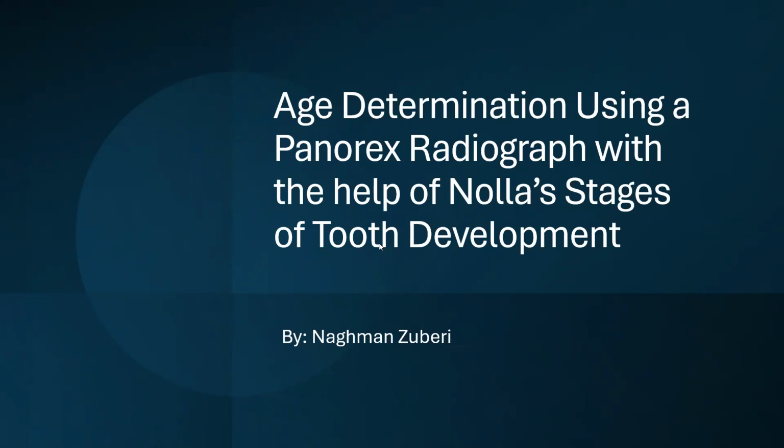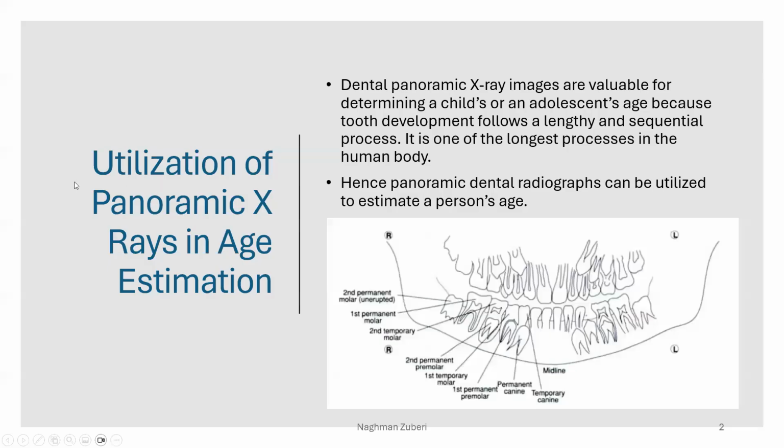Okay, guys, so this lecture is about age determination using a Panorex or orthopantomograph radiograph with the help of Nolla's stages of tooth development. Utilization of panoramic X-rays, or orthopantomograph X-rays, in age estimation.